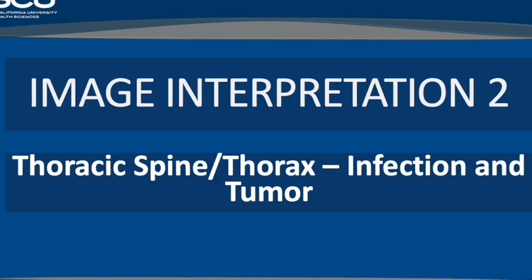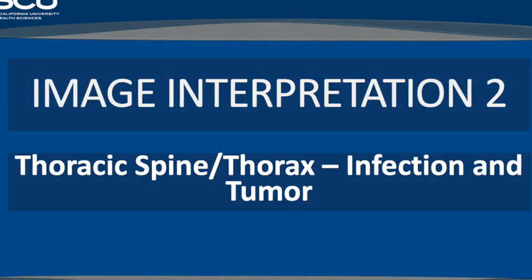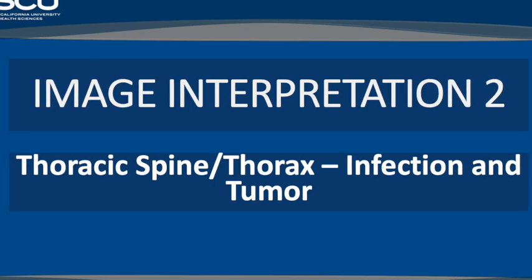The amount of destruction can be severe, leading to the dreaded gibbous deformity. The most common level affected is L1, and we may encounter paraspinal line deviation from spinal abscesses. Additionally, subligamentous spread can lead to anterior vertebral body erosion and skip lesions, keeping us on our diagnostic toes.